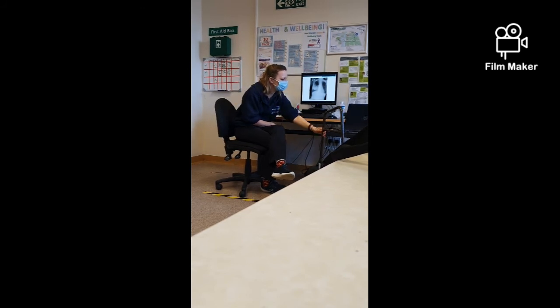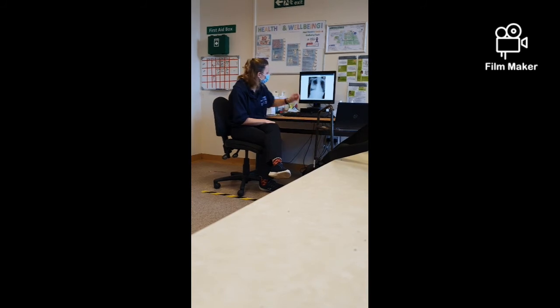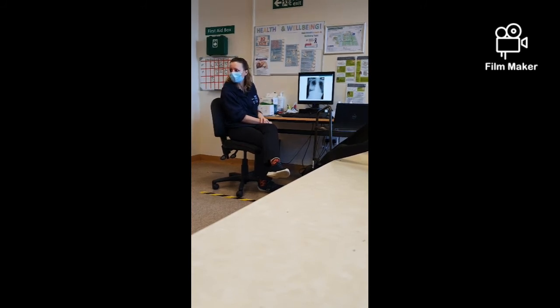I know it's difficult for you to see, Jade, though, isn't it? I'll send the presentation to you all as well, so you can have a look in your own time at these x-rays. Again, what do we need to do with this x-ray?